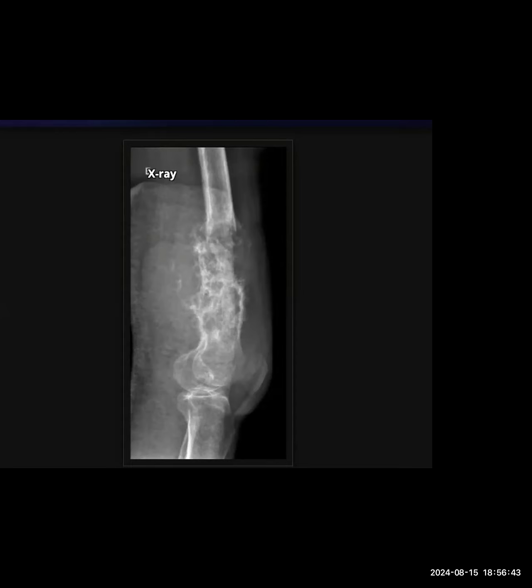Infection also would be lower on my differential, because I cannot see any lamellar periosteal reaction, but that would also be one of the differentials. So my primary differentials would be osteosarcoma or a chondrosarcoma and an Ewing sarcoma arising from the bone.